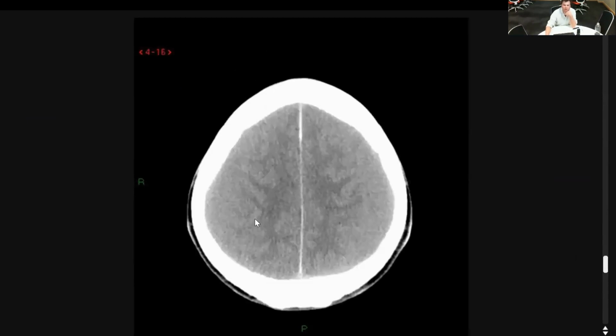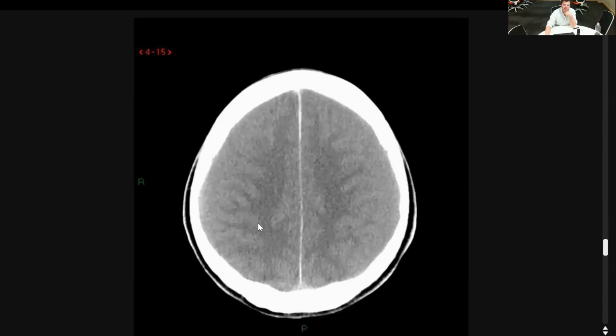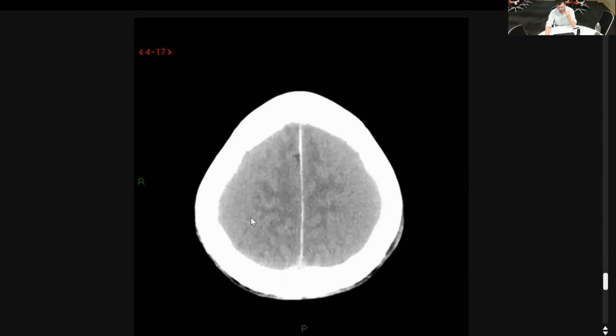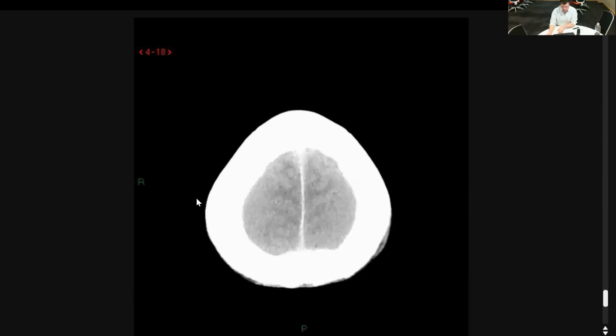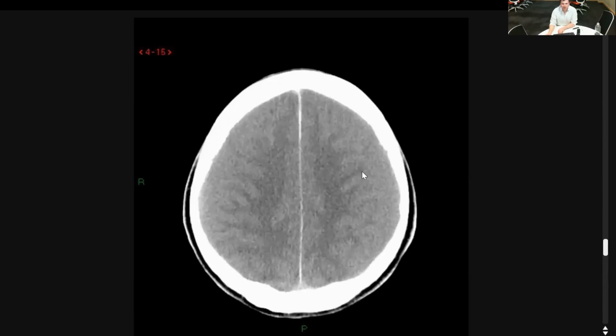Because we didn't do this one immediately overnight, they've had a bit more time, and they've come back and said that this patient actually had a minor head trauma. They fell and hit their head about 2 weeks ago. And they've been a bit confused since then. The only thing I know that causes widespread injury would be a diffuse axonal injury, but I thought you would get more loss of grey-white matter differentiation with that. Yeah, we can see the grey-white differentiation pretty well here, can't we?